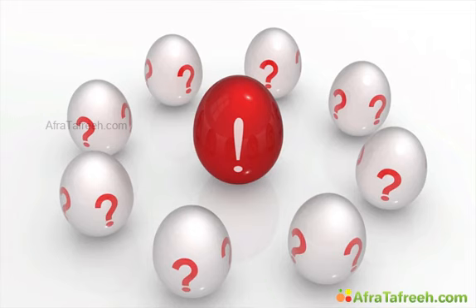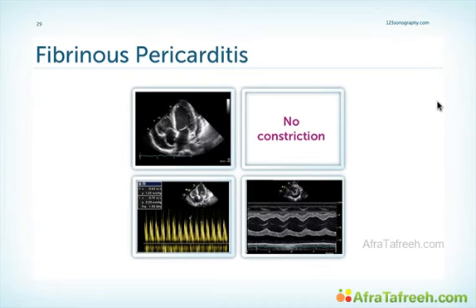It is not easy to make the diagnosis of pericardial constriction. Often you will have ambiguous findings, and very frequently you will also need cath studies to document the hemodynamic changes associated with constriction. But if you put all the pieces together, especially also looking at the clinics of the patient, you can usually make the diagnosis. In conclusion, I would like to show you 2 cases.